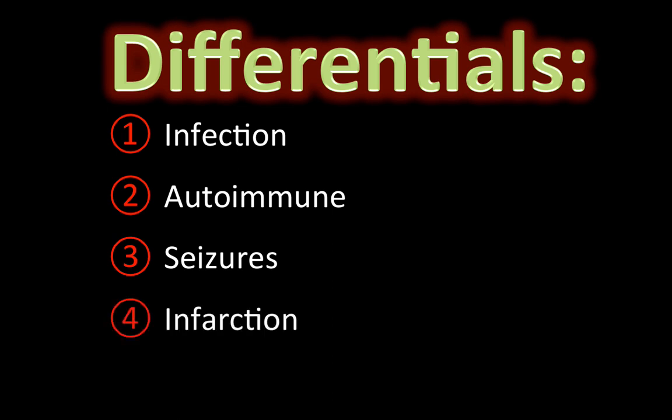An infarction in the MCA territory is something you might think of. But notice that the clinical presentation of herpes encephalitis is really different than that of an infarct, so that makes it much easier. If you're in a vacuum and don't know the patient's presentation, that might confuse you. However, the bilaterality of the abnormality and the classic location should make you think about herpes encephalitis first.